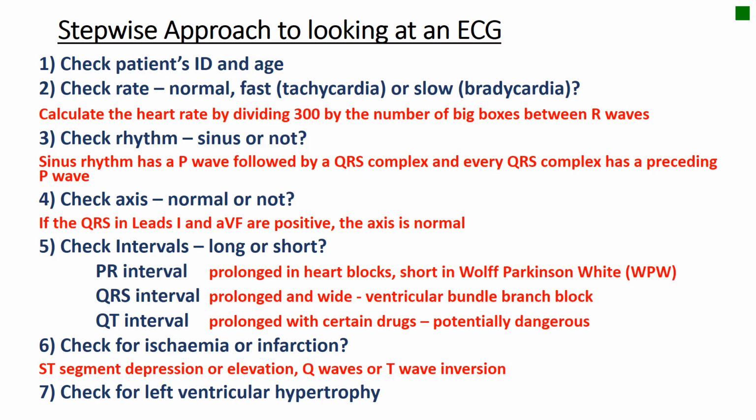We're going to look at that in a second. Check the rhythm, whether in sinus rhythm or not. Check the axis. Is it normal or is it deviated? Is it left axis deviation or right axis deviation, or is it in the normal range? Then check the intervals. Are they long or short?